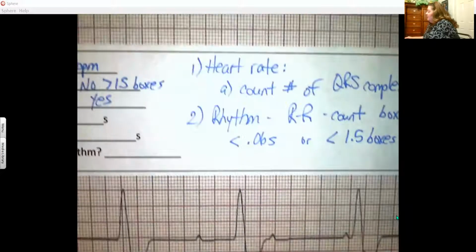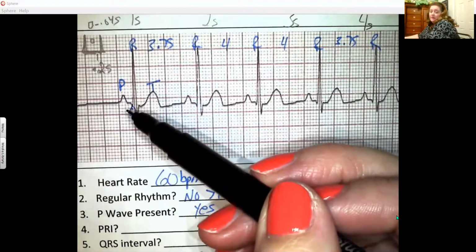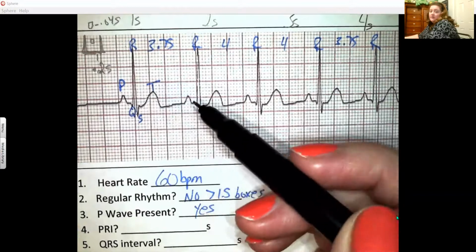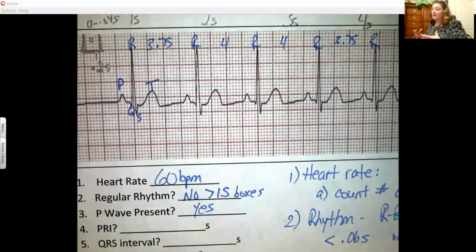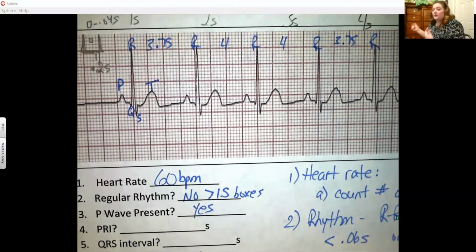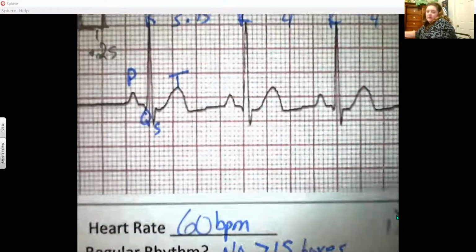So if we go back up and take a look, I'm not going to use this one. You may use something like this, but since I wrote it, I'm not going to use it. I'm going to skip over to this one. And those might be slightly off. So I might get a 0.08, you might get a 0.12. And for that reason, I always write a range for these numbers. You will just write your one number. I'll just know when I look at my key, you're in that range, so you got it right, or you're out of range, so you missed something. So I'm going to zoom in closer here.